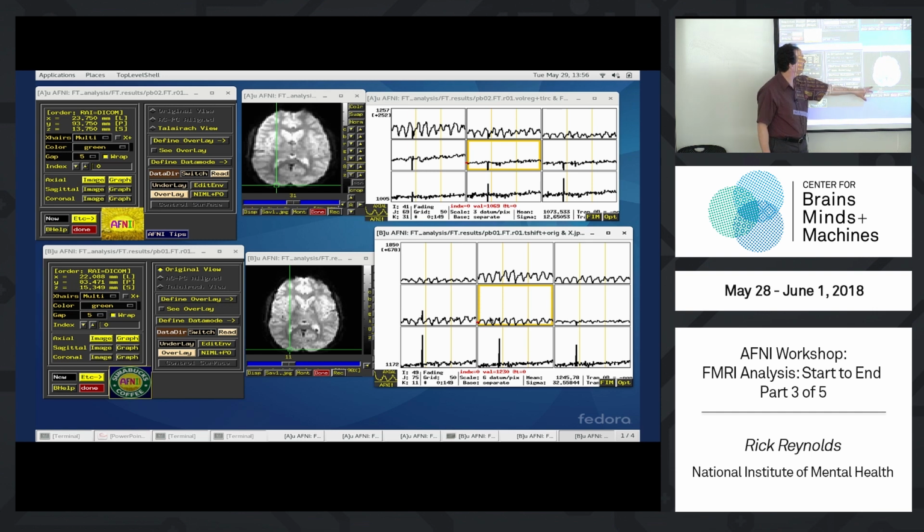The goal in AFNI, when you click on one location in one space, is that it tries to keep the location basically the same. But the rest of the brain may not, as this has been rotated and shifted and all that. So the planar cut won't necessarily match, for example, if the subject had to be rotated like that.